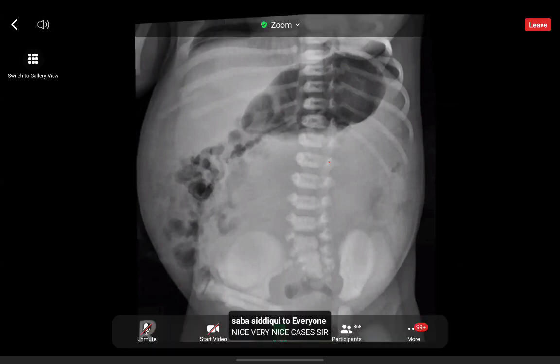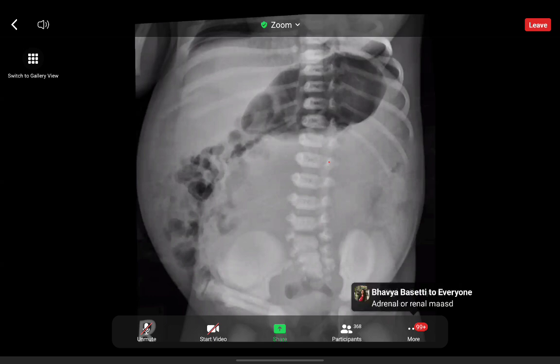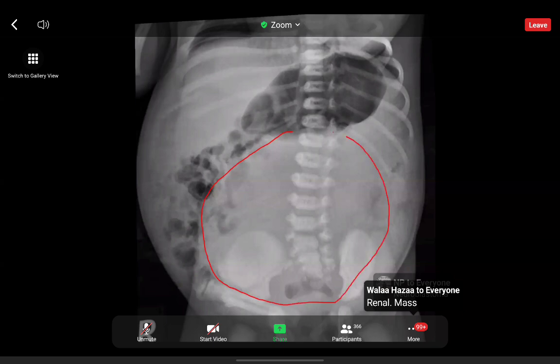Okay, this is a neonate. Mass, yes. So remember, even if this film was in the first 12 hours of life and we've only got gas in the small bowel, remember the small bowel should generally be over here somewhere on the left side of the abdomen. All of the small bowel in this case has been pushed over to the right-hand side by this very large intra-abdominal mass.